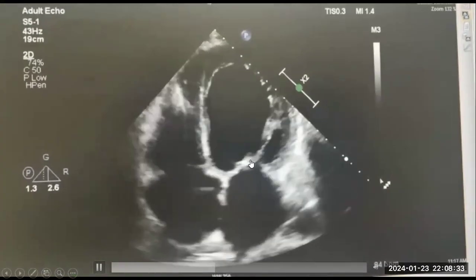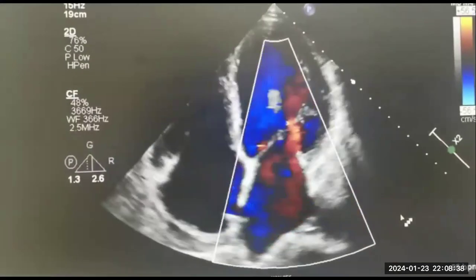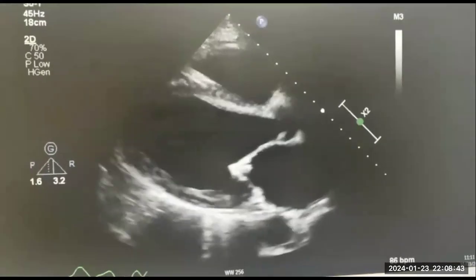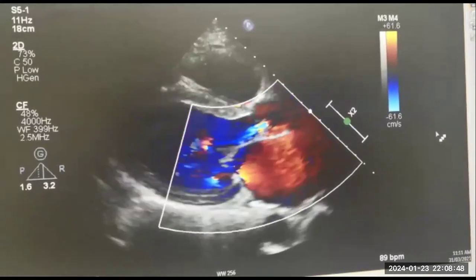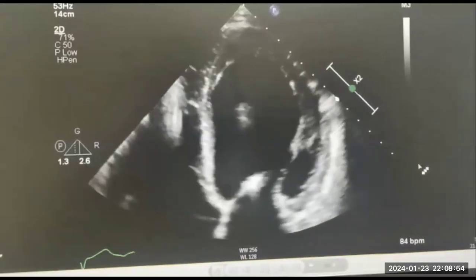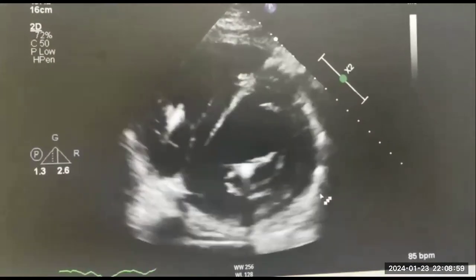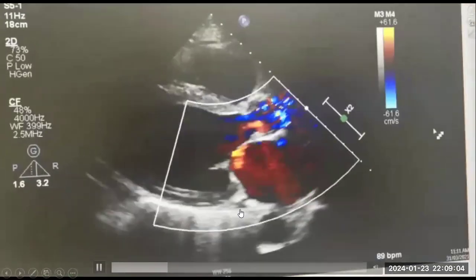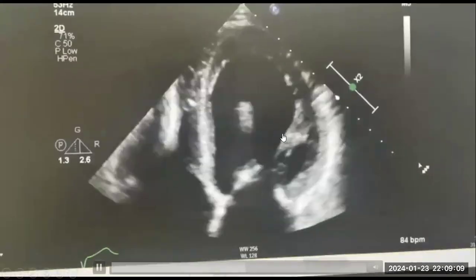So the trick here, or the finding, is that there is a clip which was detached. However, if no one comments on that, again, in the presence of DCM, dilated cardiomyopathy, you expect to have an apical tether of both leaflets or apical tenting, and sometimes significant eccentric MR. But the extra point here goes for the detached mitral clip. Maybe this is more clear. You can see here that it's attached to the anterior wall, detached from the posterior one, and it appears clearly also in the short axis view.